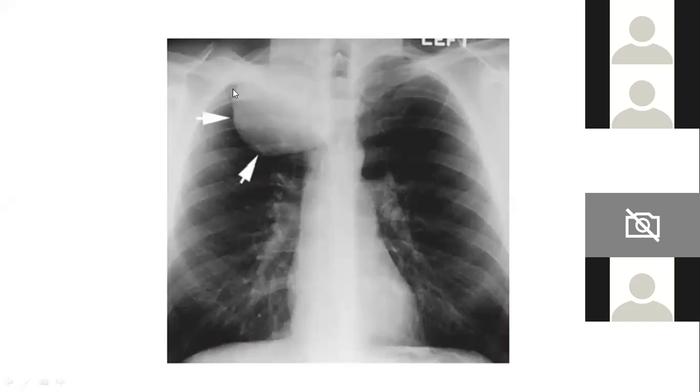We can see it is going above the level of the clavicles, correct? It's a large mass, that's what we can say. Even the paratracheal stripe, we can't make out clearly, so it is definitely there in the middle and the posterior mediastinum.